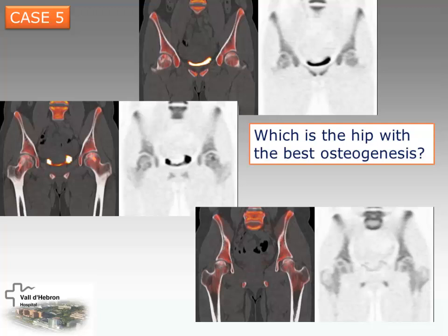Which kind of intervention? You have here the bone, the fused images. There is a fibula graft, a stem cell. Yes, on the left side. Yes. Well, I think this was on both. No, it's just on the right. You're right. Yes, yes.